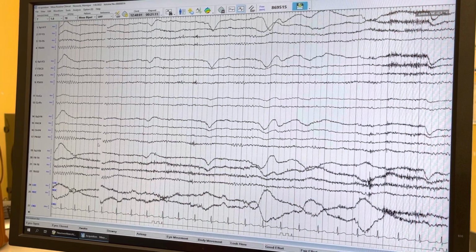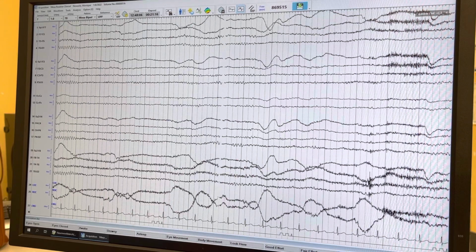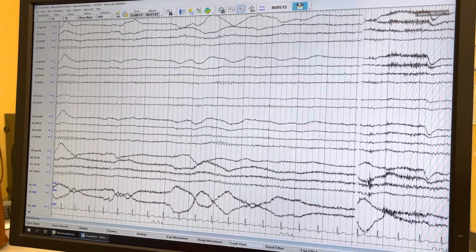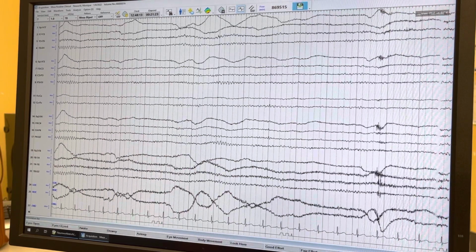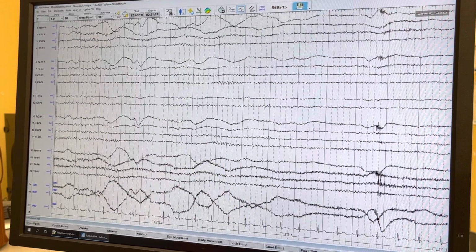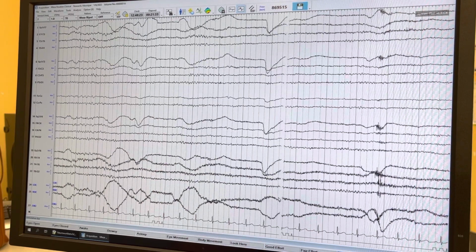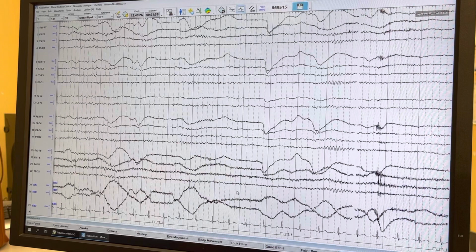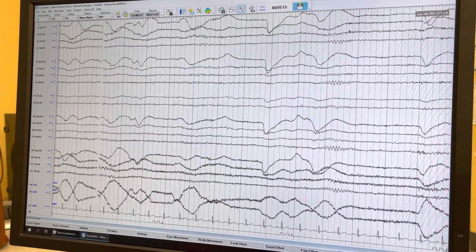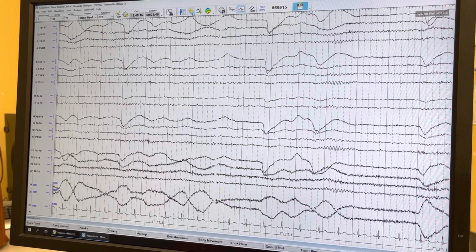Okay, so I just wanted to go over some of the functions of the Nihon Kohden for your clinicals. I'm going to go over some of this stuff and do a PowerPoint and some clips with some other functions on here, but I just wanted to do this video to show you guys a little bit on how to start a file and how to use these functions here. If you have any questions, we can start it up in class and you can play with it a little bit.